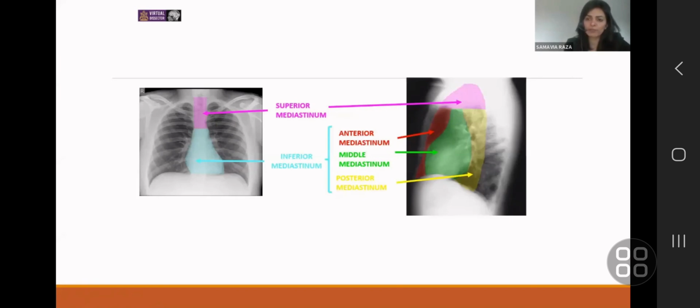On the frontal radiograph, what comes into play are the silhouette signs and the hilum overlay signs, and I'll go over them when I talk about pathology. So today we are not talking about pathological signs. We're only focusing on the normal anatomy and the terminology. So don't be put off that I didn't go over the hilum overlay and all of that. We'll come to that when we go through those specific pathologies.